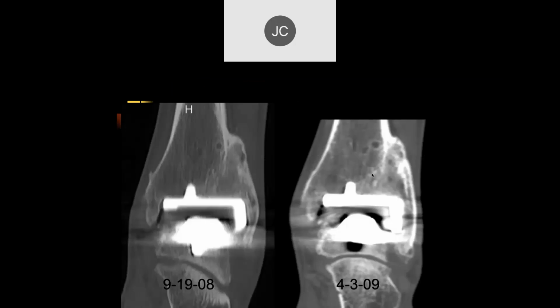Robert, what do you think of this case? Here it looks like there's been a tibio-talar joint replacement there. Prosthesis. Hardware looks like I think it's well aligned, but I haven't seen a whole lot of these.